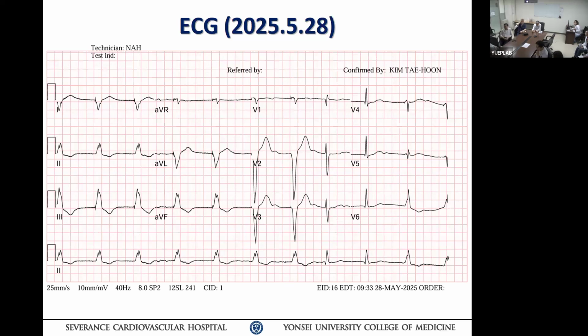This one, what do you think? That is a different curve. Yeah, a different QRS complex. But then you don't see any pacing spike before this one. Where might it be? Oh, there is one before. Right. So basically, this is a fusion between these two, and this is what we call a fusion complex, because we have an atrial fibrillation capture that went down at the same time the pacemaker fired. So then you can already tell, based on this, what is the minimum rate that this pacemaker is programmed to.